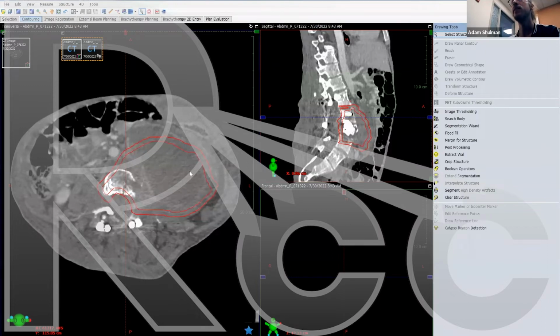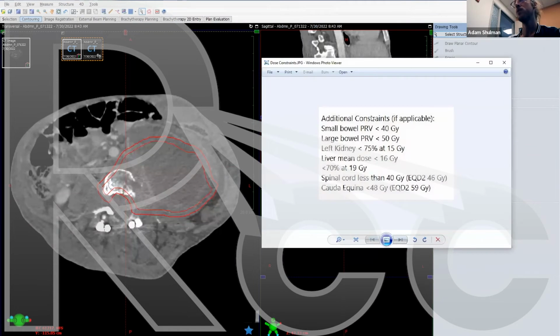Now, if I put on a CTV or a GTV and it's not covering, I can tell the doctor ahead of time. I can go to the doctor and say, okay, this is what you told me that you have to have. I can tell you before I ever even start planning, I can achieve exactly this coverage, but I can't do better. I've maximized my dose fall off. This is only what I can achieve. So if I'm missing CTV or I'm missing GTV, then you'll have to tell the doctor, this is what I can get. I'm going to miss some CTV. I'm going to miss some GTV. Do you want to sacrifice any of these organs at risk more than you are now to allow me to cover that CTV or GTV?